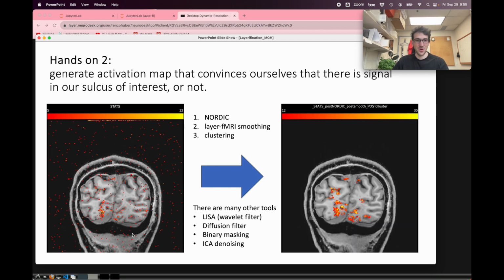So basically I want to show you how we get from images like that, from the same data, to images like that, where it turns out that actually those clusters here were more coincidental. They don't really seem to survive these kinds of filters. Whereas other clusters, which were just barely visible, are actually real in the 3D structure there. But of course, every filter is based on assumptions, and those assumptions might be violated. So there's always a trade-off. Do you really want to do this or not? Sometimes we're just desperate enough to do it.